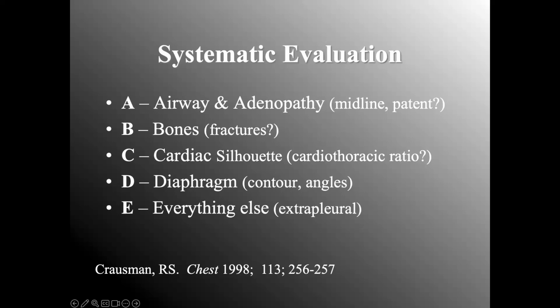Everything else, I know you thought we were going to go to Z, luckily we're not. We'll end with E here. Everything else is basically outside of what we did not list here. So just a good systematic approach, and I'm going to use this as we move forward in interpreting the various chest X-ray examples that I'm going to give you.